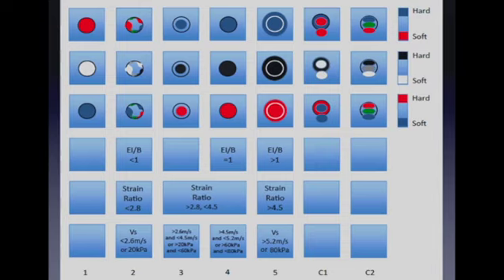So again, all the manufacturers except one will allow you to completely eliminate the B-mode image from the elastogram. So in all the images I showed you, the image of the B-mode is by itself and the image of the elastogram is by itself. But I've color-coded these based on kind of a BI-RADS score going from 1 to 5.